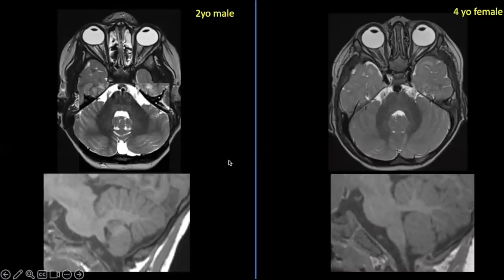Okay, so here are two different patients that presented both with bilateral abducens nerve palsies. The first thing you should think about and rule out with this history is intracranial hypertension, as raised intracranial pressure can stretch and secondarily cause dysfunction of the cisternal segments of the abducens nerves. This is called the false localizing sign. And when this is ruled out, then next you want to follow the expected course of the abducens nerves from the brainstem, pontomedullary junction, through the cisternal segments, Dorello's canal, cavernous sinus, orbital fissure, orbit, lateral rectus muscle, right?